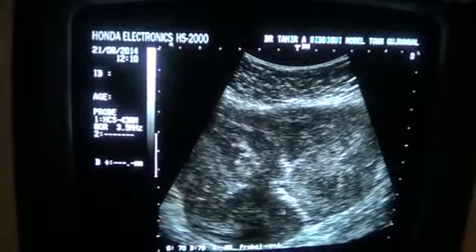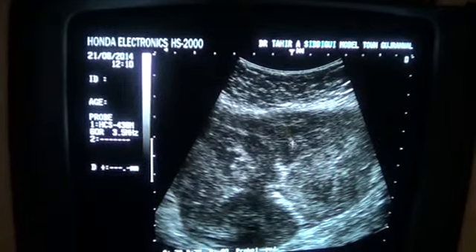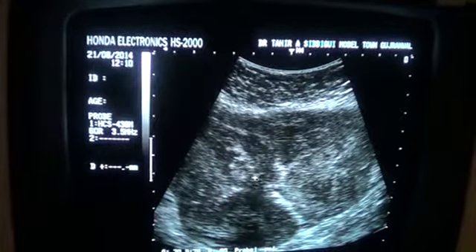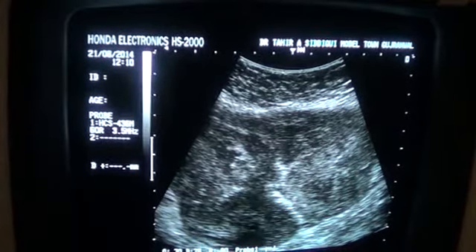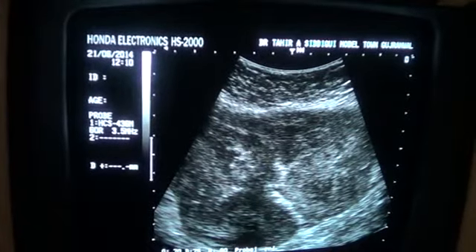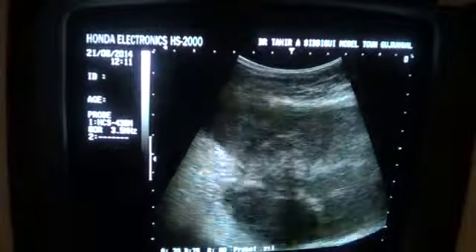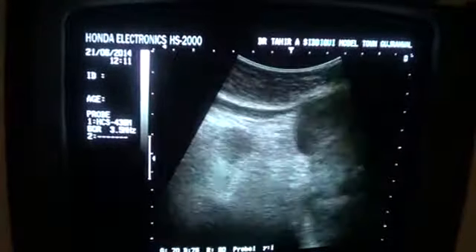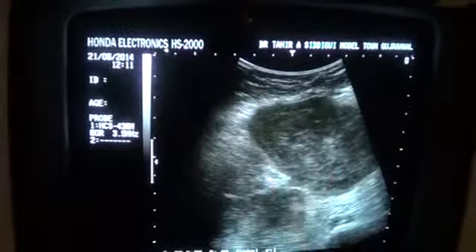There are a few cystic areas within it, small, and you can see multiple tiny internal calcifications. There are thick septa. This is a Y-shaped septum, and this is a very large mass that extends.